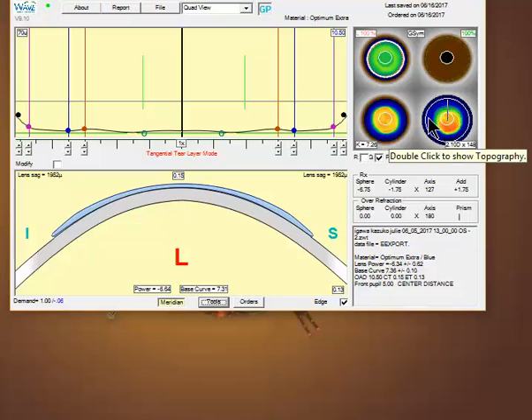And remember, a tangential modality will probably flatten the lens design about a half diopter. Wave will adjust the powers accordingly for this patient. So hopefully that'll get you a little bit better alignment and a little more consistent comfort as the day goes on.